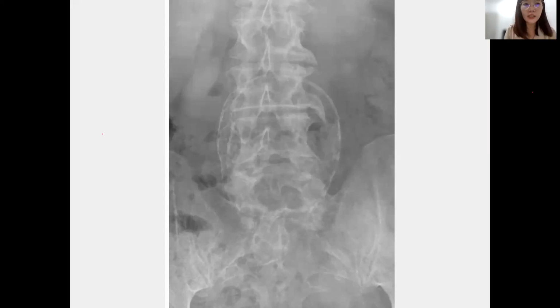When you look at the X-ray, we cannot give an exact diagnosis. Always refer for ultrasound anyway, to differentiate whether it's actually fibroid or stone. If we are not sure, we will have additional imaging for the patient. If we can detect the calcification, that is good enough for our level.